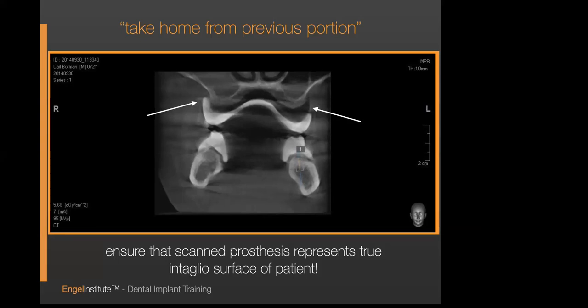So when I said it's really easy to determine if you have space or not, the way that we do it is we want to go in and out of the coronal view, in and out of the patient's face, all the way through the denture, come back forward, go back through it, do it 2 or 3 times. And if I see any space like this, we are going to rescan.